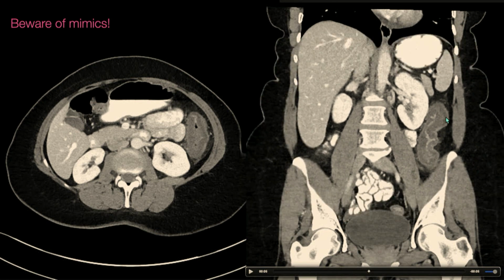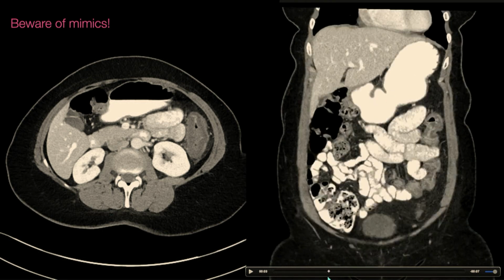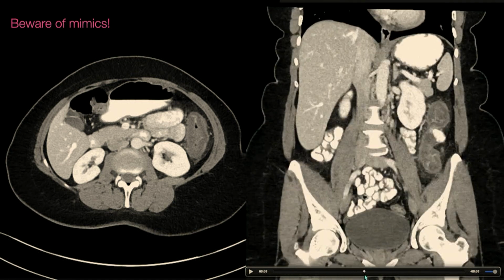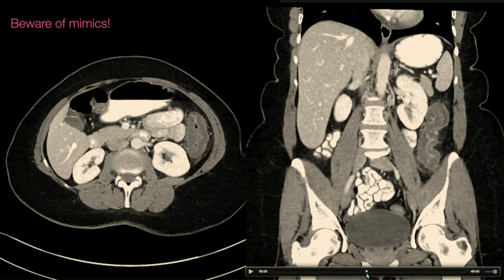and look at that impressive submucosal edema, mucosal enhancement, and that serosal thickening and enhancement. But we're really along the vascular distribution here. We're along the distribution of the IMA. This is a case of non-occlusive ischemic colitis. And this is a very, very typical place. In fact, this is one of our most common diagnoses that we make out of our emergency department for all comers for abdominal pain. The patient will present with bright red blood per rectum, and you're going to often see involvement in an IMA distribution, but it's non-occlusive ischemic colitis.